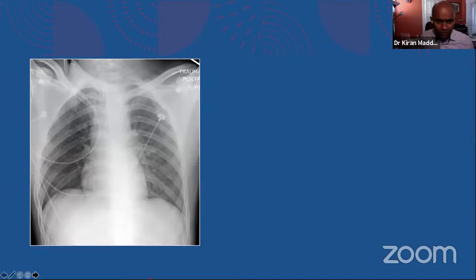Okay, so again, another case of mediastinal widening. Anybody wants to talk about any other findings in this patient? Doreen says hemorrhage. Yes, dissection is one thing, but I'll come to that immediately. And Doreen, good answer, hemorrhage in the mediastinum. That's called mediastinal hemorrhage.